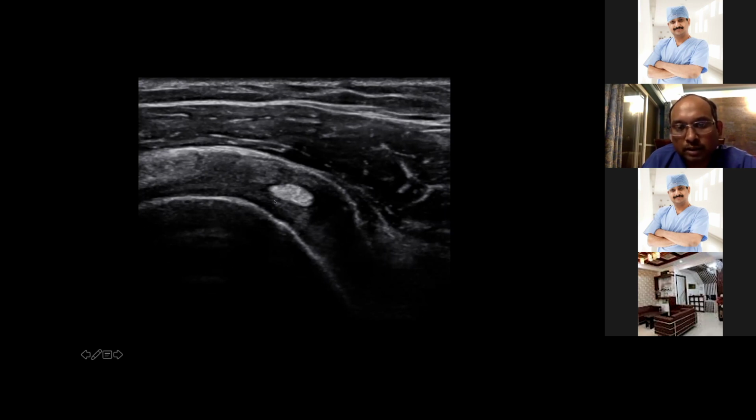Two ligaments can also be seen in this view. One is the superior glenohumeral ligament, which I will show you in the MRI, and also the coracohumeral ligament, which is seen above the biceps tendon. So these two ligaments can also be assessed. Also, this is the rotator interval. If we are seeing any fat haziness, which is not seen here, in case of fat haziness, the dark area will be seen over this area. And this is also a sign of adhesive capsulitis.